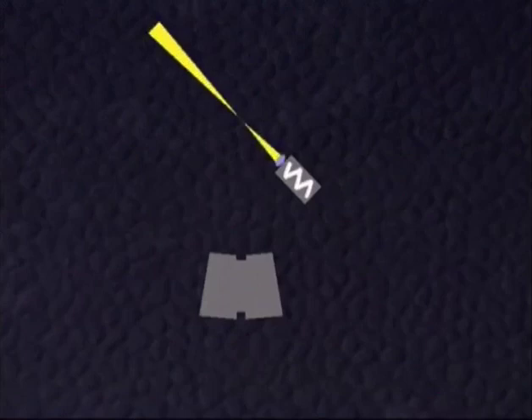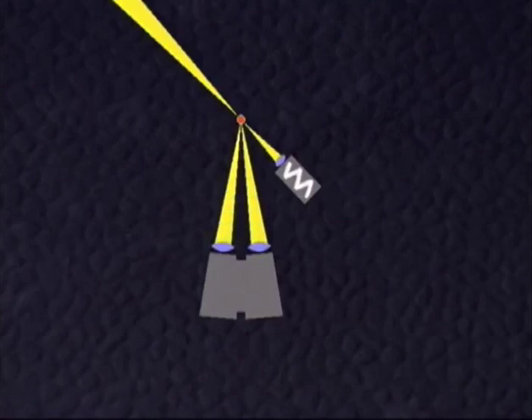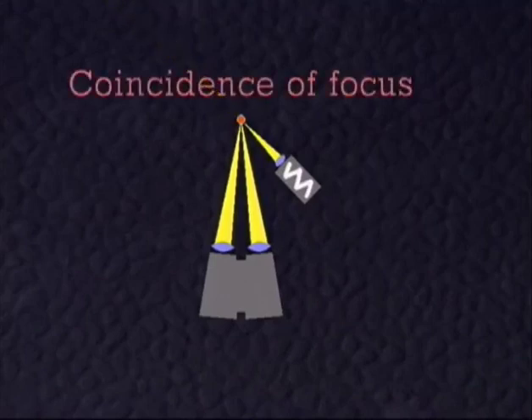Both the maximum of brightness and of sharpness of a given light source exist at the focus of the light beam. Therefore, the observation of scatter is optimal if the focus of the microscope is exactly at the same place. In other words, the focus of the light beam and of the microscope should precisely coincide. The coincidence of focus is an essential feature of slit lamps and will be discussed in detail later in this series.